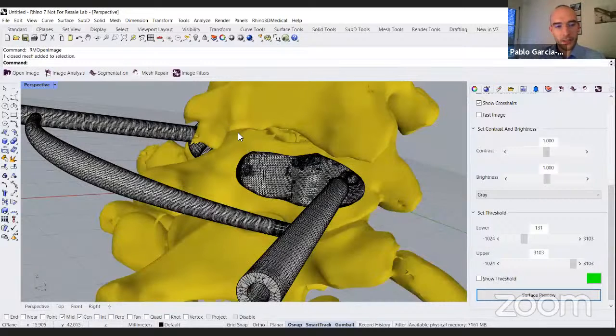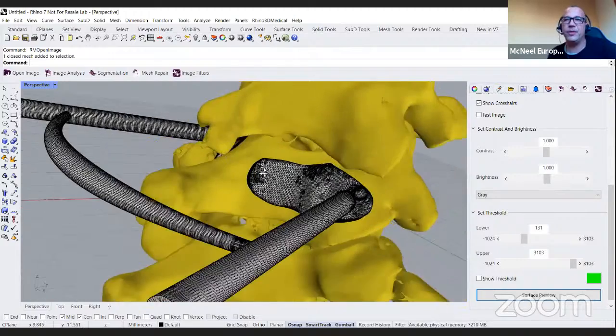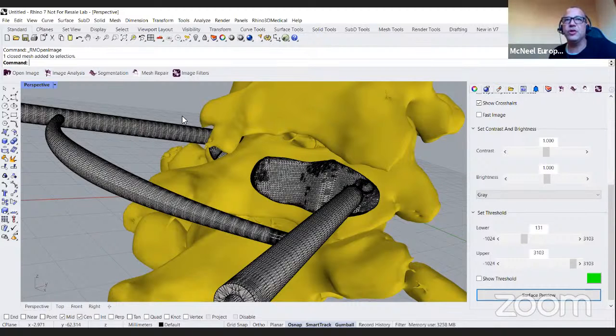Through the plugin, no, right now, but I think through Rhino it's possible. You can select a plane in Rhino and then extract different properties. Or you can create a surface over that area and extract properties from that surface, like the area, as you said, and maybe you can show it on your screen if you go to the Analyze menu.